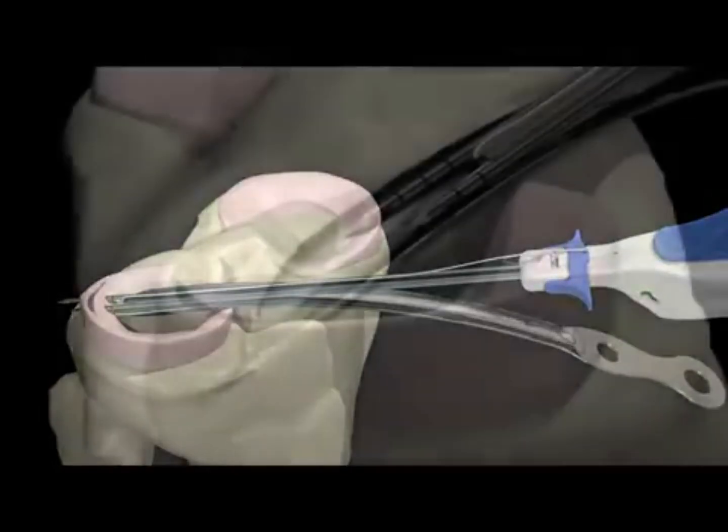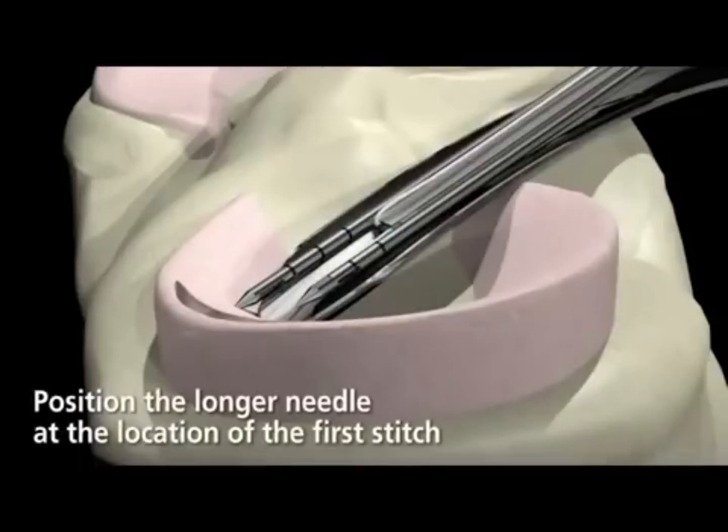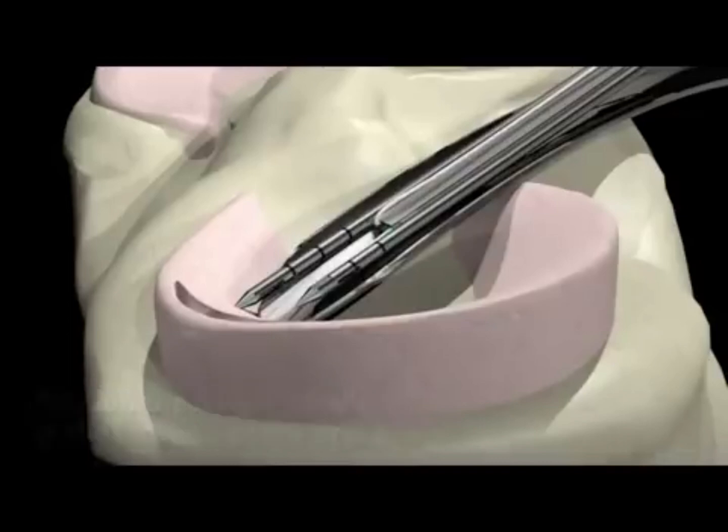Carefully advance the AS meniscal repair device against the meniscus at the predetermined point of penetration at the repair site. The alignment of the needles on the device is critical. They are not designed or intended to manipulate or position tissue. Do not subject the device to forces that may misalign or bend the needles. Doing so may affect their ability to place and/or pass the suture.